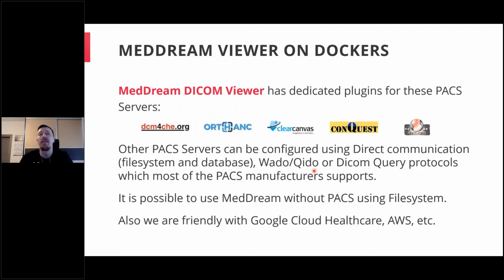Also, to mention that it is possible to test MedDream or even to use it in production without using a PACS. So it is possible for MedDream to access the studies and show them using the file system. Basically, you would have a root folder where you would put all your studies, and you would pass the URL parameter, or using token integration, you would pass the path, which specific study, which specific folder or subfolder you would like to view, and it will open. So MedDream can also work with the file system.